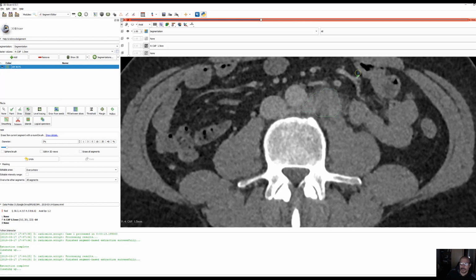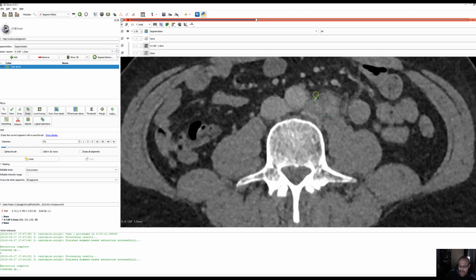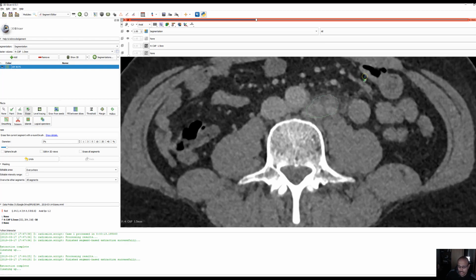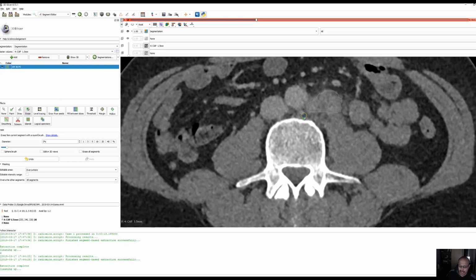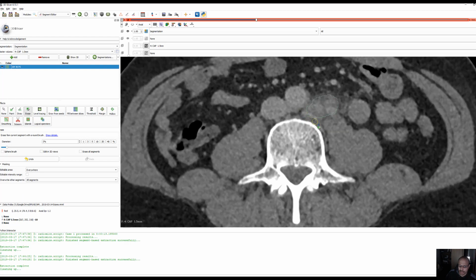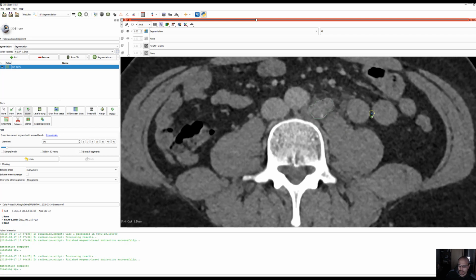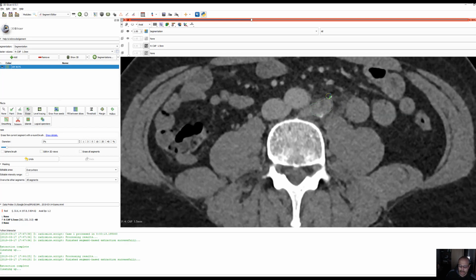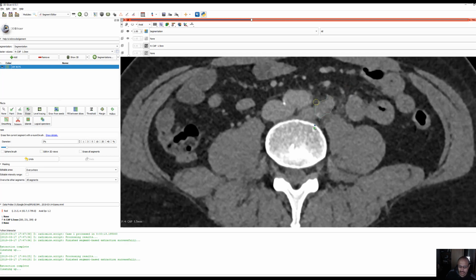Yeah, just remember we don't want tons of tissue. You know, we've got a good representation of the tumor, so it's okay to miss a couple of slices, especially for the sake of accuracy. Like if that is a vessel, you don't want any part of that vessel inside the lesion. So you just have to be very careful that you do not include any anatomical structures within your region of interest. That cannot be emphasized enough.